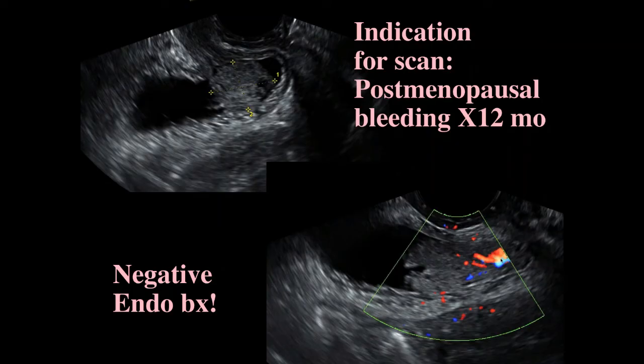And this had been totally missed as a bladder lesion by the gynecologist, who had thought that postmenopausal bleeding was from up higher, and was looking at an endometrial biopsy. So this is really a lesson here to get a really good history and consider all the things that are down there, not just the uterus.